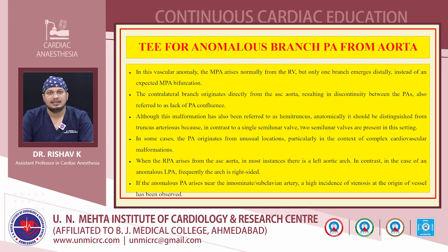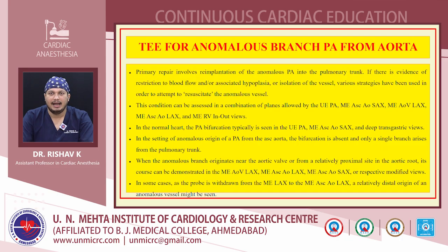In some cases, the PA originates from unusual locations, particularly in the context of complex cardiovascular malformations. When the right pulmonary artery arises from the ascending aorta, in most instances there is a left aortic arch. In contrast, in the case of an anomalous left pulmonary artery, frequently the arch is right-sided. And if the anomalous pulmonary artery arises near the innominate or subclavian artery, a high incidence of stenosis at the origin of the vessel has been observed. So in this anomaly, primary surgical repair involves reimplantation of the anomalous pulmonary artery in the pulmonary trunk. However, if there is evidence of restriction to blood flow and or associated hypoplasia or isolation of the vessel, various strategies have been used in order to attempt to resuscitate the anomalous vessel.